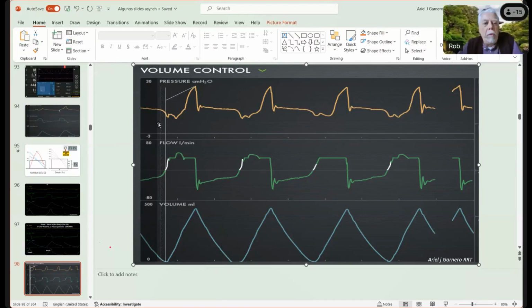Okay, so we already mentioned that during the inspiratory phase, for three of these breaths, we're seeing a small amount of work shifting.